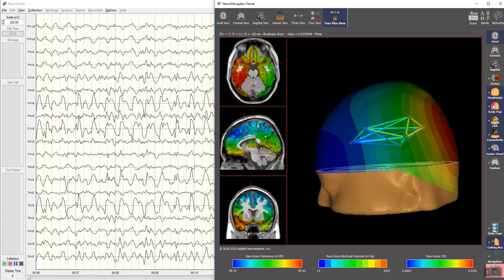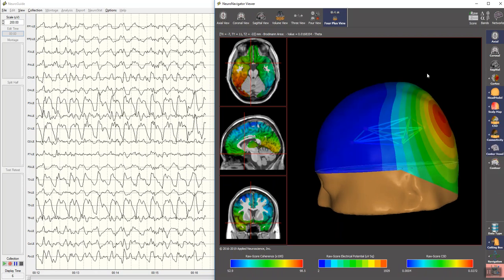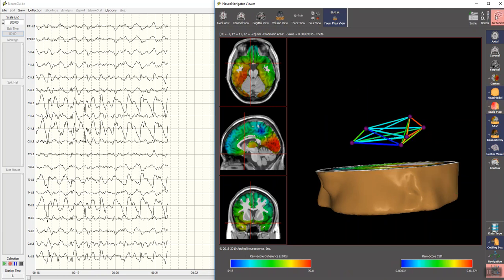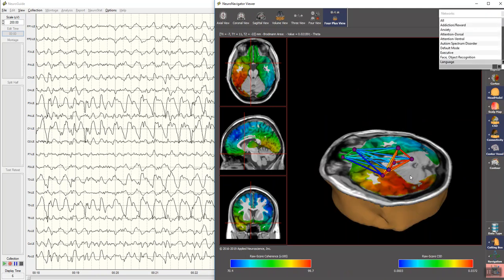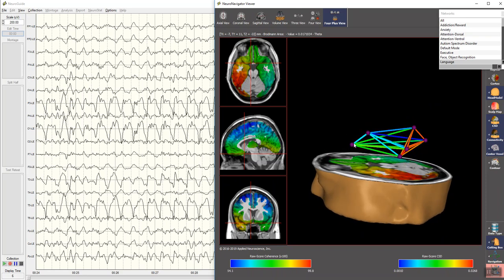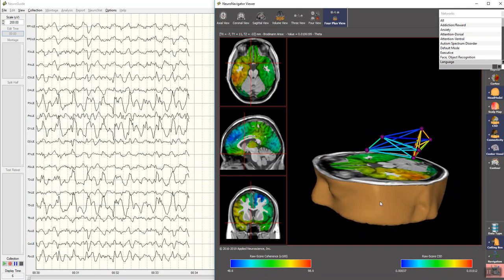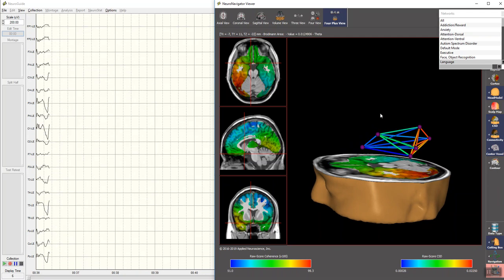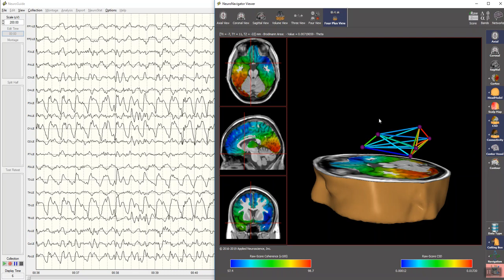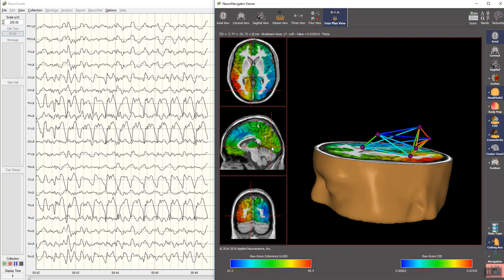And we can also look at the scalp if we wish to look at the electrical potentials at the scalp in real time or offline. This is the language network in the left hemisphere of this individual, in which the hubs are Brodmann areas, and the language network is determined by PET scans, functional MRI, and published in numerous papers and by numerous people, and established primarily funded by the National Institutes of Health through the Human Brain Mapping Program.